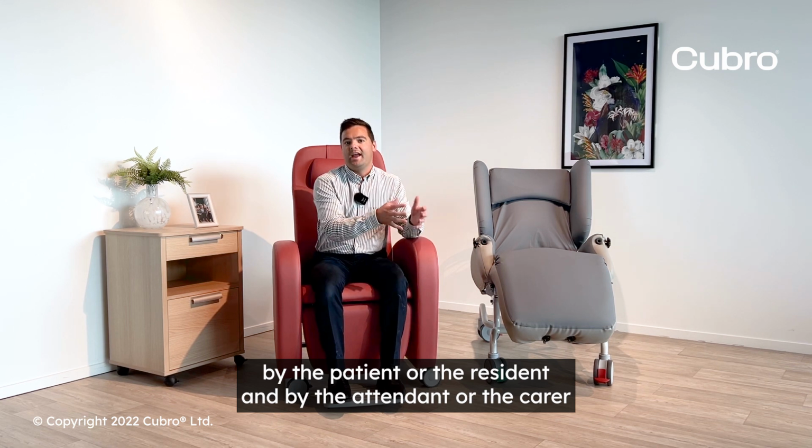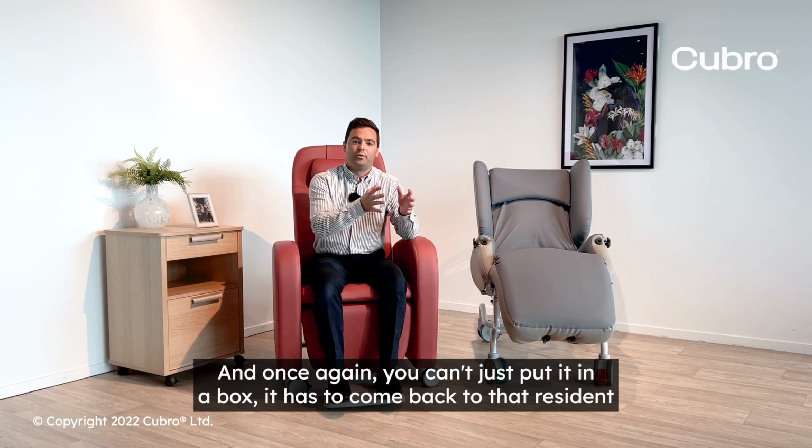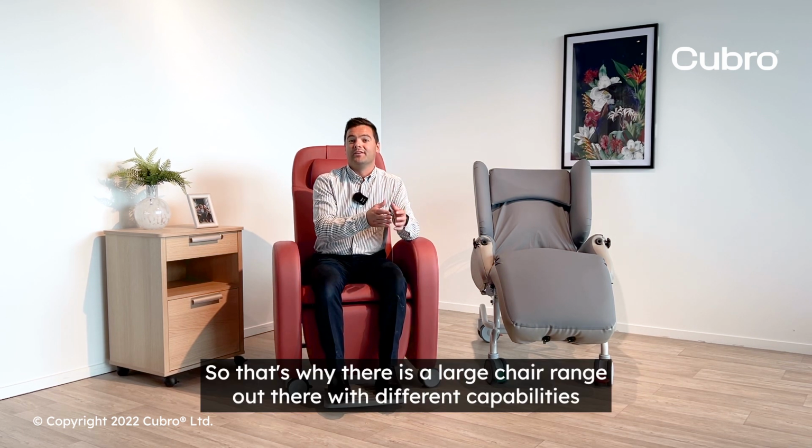So our key point is you do have these different chairs with different levels of adjustment by the patient or the resident and by the attendant or the carer. And once again, you can't just put it in a box. It has to come back to that resident assessment to identify whether it is restricting their normal freedom of movement or it isn't. So that's why there is a large chair range out there with different capabilities.